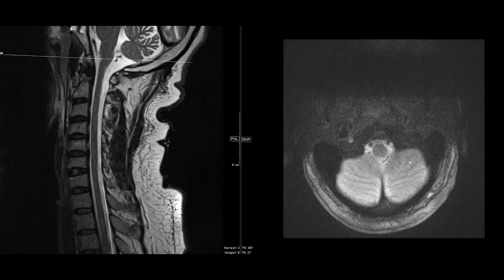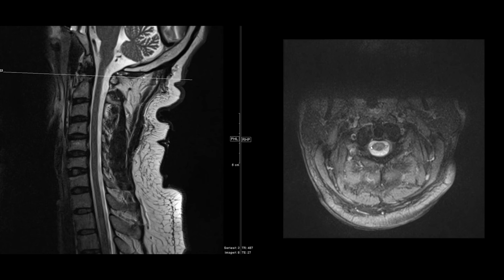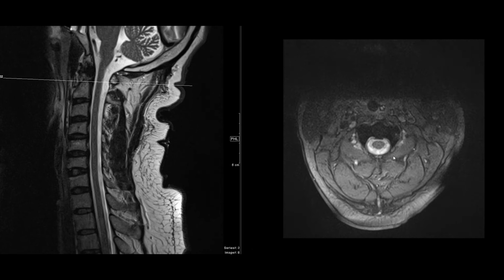While you're looking at the spinal cord, you may also take a look at your gradient echo. This is a gradient echo axial that you have on the right here. This is going to be more prone to showing things that have susceptibility effect, so things like blood or calcium. You'll often see them in studies that are done for trauma, and what can help you is to look for areas of contusion or hematoma within the spinal canal.